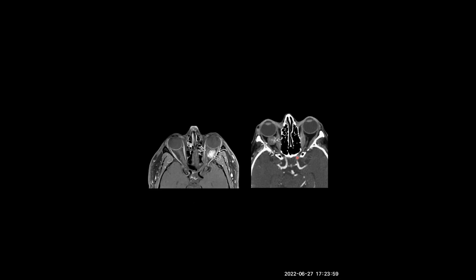Okay, here you see the patchy enhancement, and here it is. This is the CT, and here it is in the MRI. An MRI without contrast will present with high signal, but with contrast, in the CT or MRI, it will present with the filling in. Okay. Next is the hematoma.